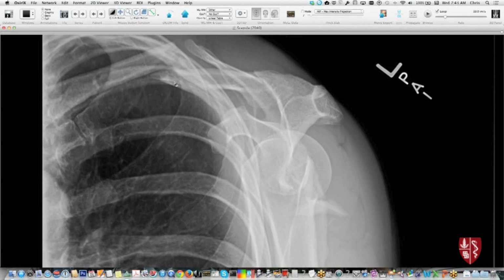So here I've gone to a different view. Here's the clavicular fracture. Here's kind of the Y view. Here's scapular spine, base of coracoid, coracoid itself. And so the glenoid is in here. And what we're seeing here is this lucency through here because there's a scapular fracture that cuts across the glenoid here. And then there's a displaced component of the actual glenoid down here. Now the humeral head's still actually pretty well located in this patient, but there's two injuries, and probably this injury is the more significant one than the clavicular fracture.